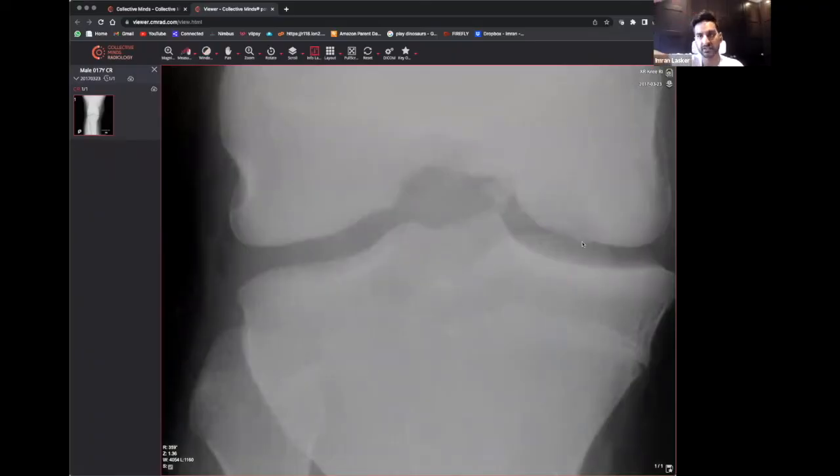And remember, there's a curved appearance to that femur. The stages of osteochondral defect are stage 1, stage 2, stage 3. The final stage is where you actually get dislocation of a defect of the bone, and that just flies off somewhere. So there is a possibility that this may be the donor site sitting over here, the donor site of this fragment of bone, because there's no fragment of bone sitting over here. And this patient's come in with, I think it was, a locked knee. So that's just something to be aware of. The medial femoral condyle, and sometimes you may have a very subtle appearance of what is essentially an osteochondral defect. And that'll be one of the things that I'll be worried about on this particular X-ray.